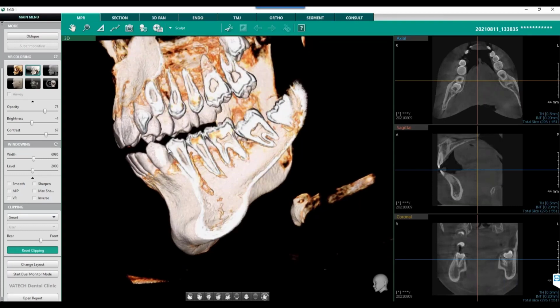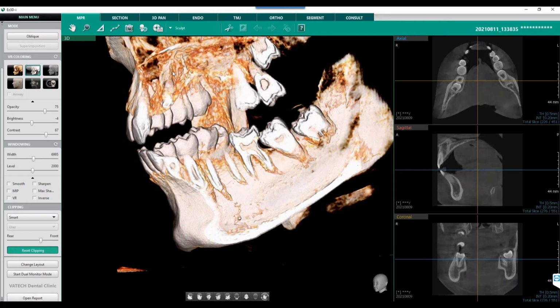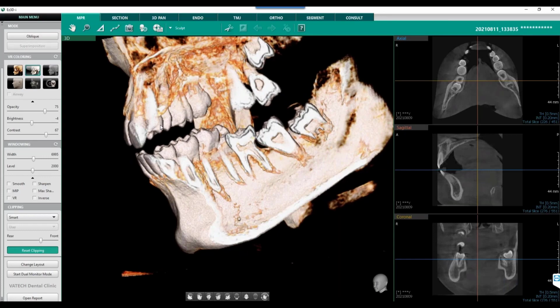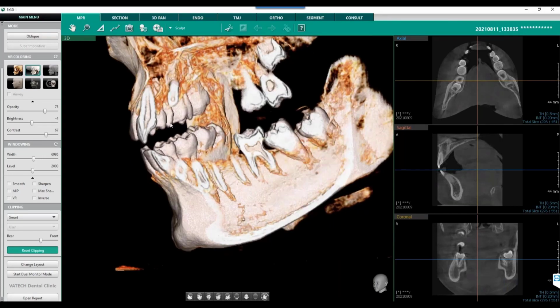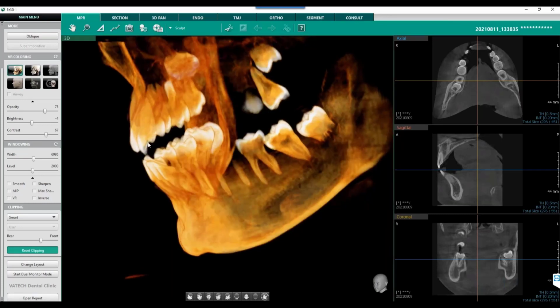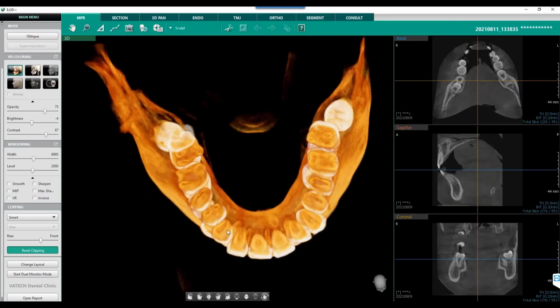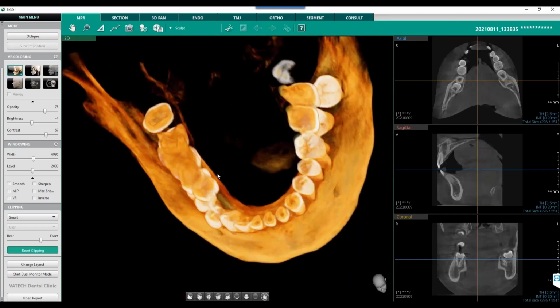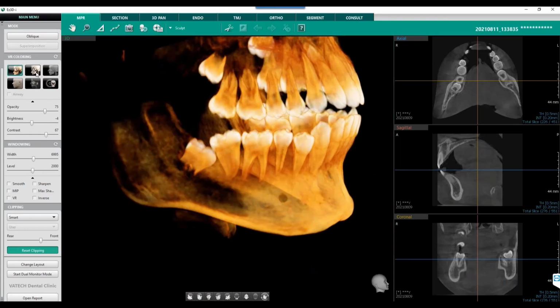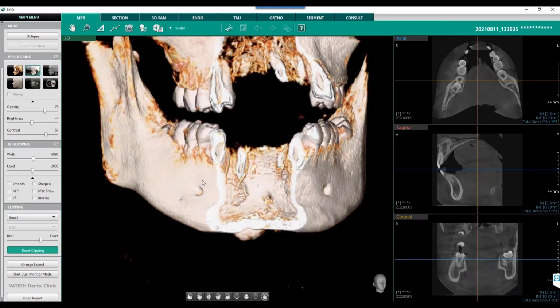And there's several ways to do this clipping, but as we go across, we can start to see in the maxilla here, we can see that little mesiodens right there, that supernumerary in that palatine duct. Another way to view that is, let's change this over to our teeth mode. And as I clip through, you can really see that right here, or if we come down and flip through, we can visualize that in there. So this is one way to rotate through, looking at our images through here, and utilizing our hard tissue / soft tissue rendering.